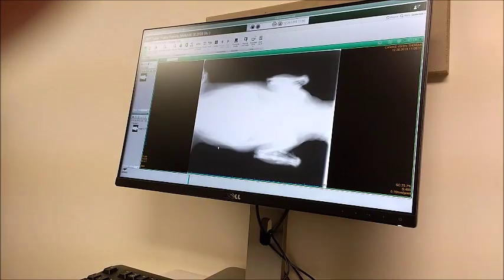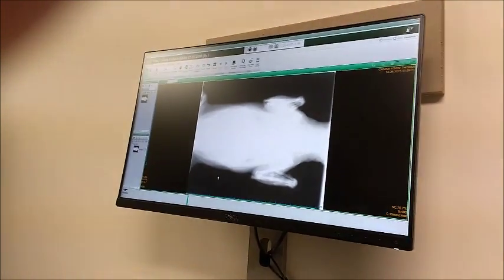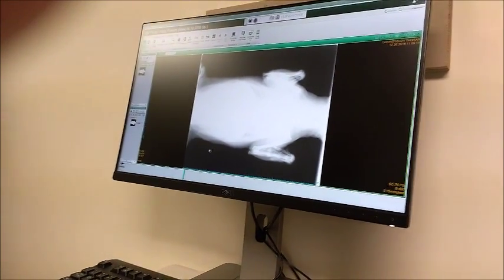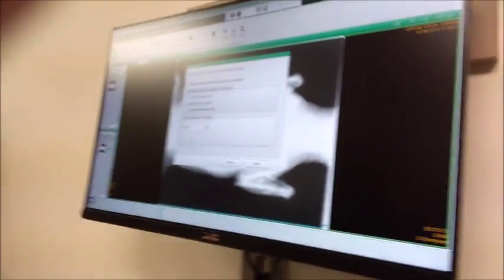Probably got to need another disk. We don't really need to save it. Usually, when you put these in, something pops up. Oh, it came out anyway. I don't know how far it's going to let me go with an already written disk. Oh yeah, so you would put launch the viewer. Do you see that, Tom?